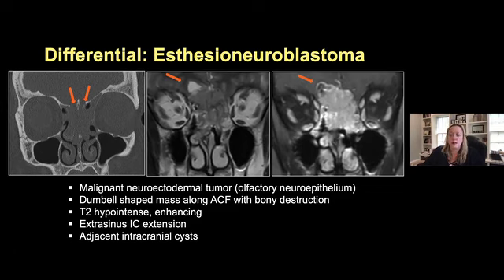As in other malignancies, you want to review the soft tissue windows on CT, and you want to look for extra-sinus extension into the adjacent anterior cranial fossa. If I windowed this down, you might see abnormal soft tissue there. That's going to confirm that it's more of an aggressive process. If you ever think that you're dealing with something that is not benign, simple polyposis, or you're not sure, always get an MRI. That's one of my big teaching points.